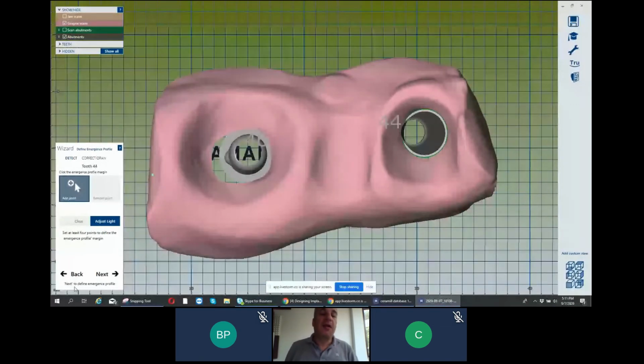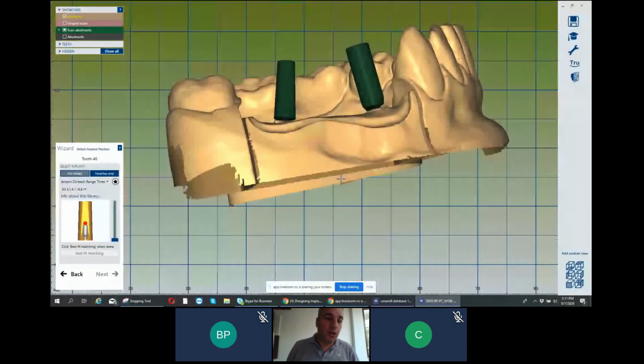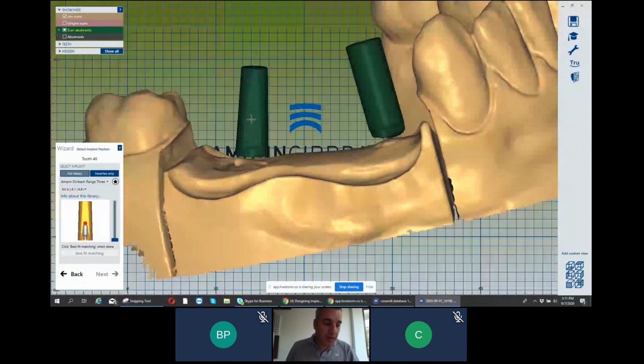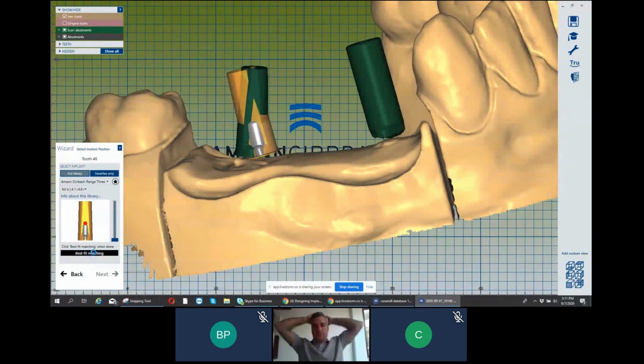That's why always scan your flat area buccal. Make sure to choose the red dot in the right place with control position. Click on best fit match with control, to make sure that you are working properly.